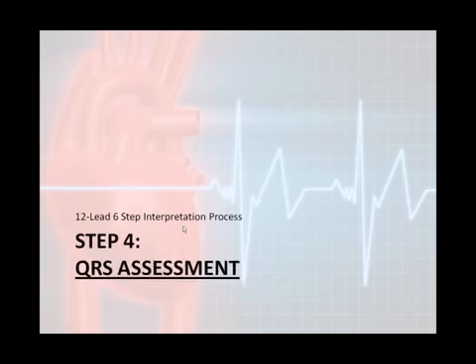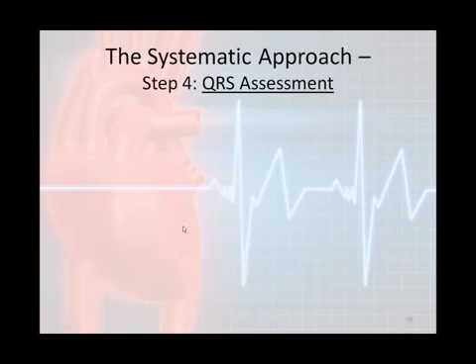Step 4 is actually the QRS assessment. Now, we're not going to get heavily into the QRS assessment because the QRS assessment and the rest of these steps are actually specific components in this course. So for step 4, I'm just going to briefly cover the rest of these, and then we'll practice a little bit using the first 3 steps: the general impression, calibration, and the rhythm interpretation. So step 4 is going to be the QRS assessment.